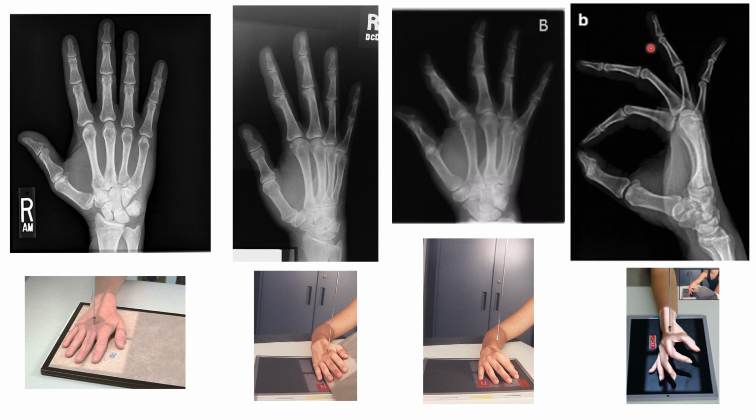Also, we can see much more concavity on the anterior or palmar side of the shaft of the phalanges and the metacarpals. And then posteriorly, on the more dorsal side of the hand, the posterior part of our phalanges, we can see a more convex curvature of the bone. Convex curve means it's curving away from the midline. Concave curve means it's curving toward the midline.